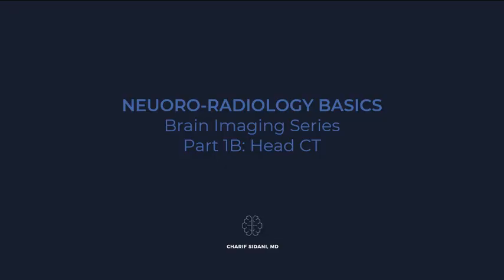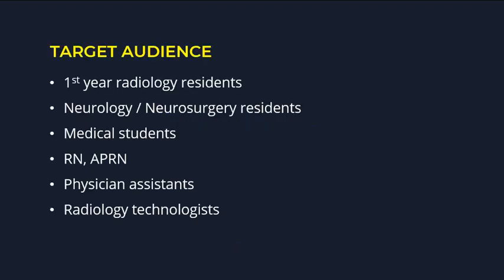I'm a neuroradiologist. Thank you for joining me for part 1B of my head CT lecture series. The target audience for this lecture is wide: essentially anybody who wants to develop a search pattern for interpreting a CT scan of the brain, whether it's first-year radiology residents, neurology or neurosurgery residents, medical students, nurses, physician assistants, or radiology technologists, among others.